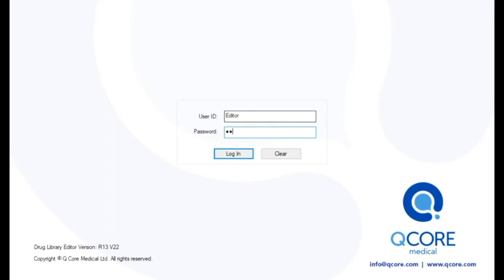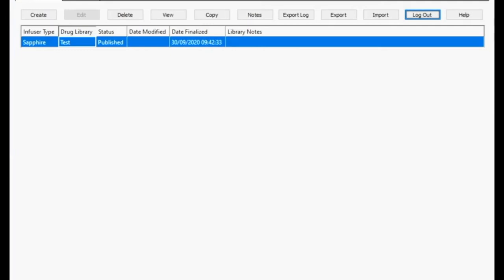So you will be sent a link and passcodes via your email, and you will just save that link to your computer. You will open up and you will be looking at the screen you see here after you log in.